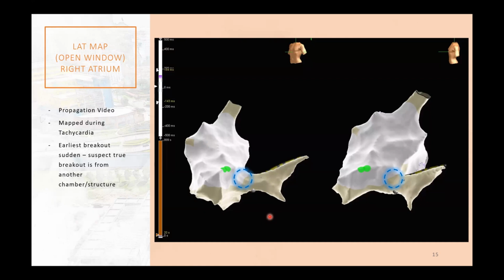So if I see on coronary angiography the MCV orientation is too close, the answer is no, you're not ablating there. You have to chase below the ventricle or a different site above. That would be the first site of ablation. The very last, no other choice: you don't find any pathway potential except in the MCV. Don't burn more than three times, you will get the stenosis. That's for sure. So a single burn, if possible. That's why you need bipolar, unipolar, every tool you've got. Take a look, then decide to ablate.